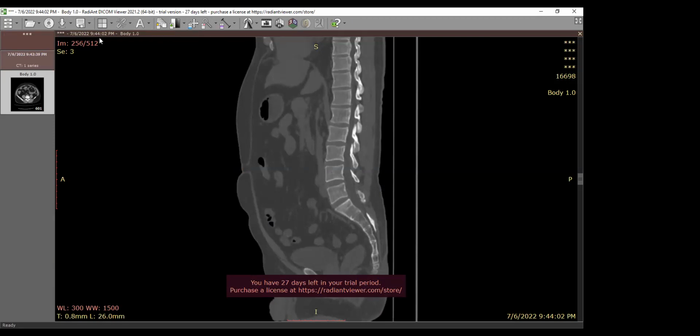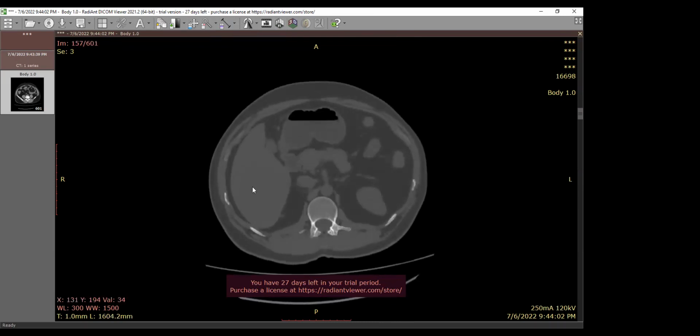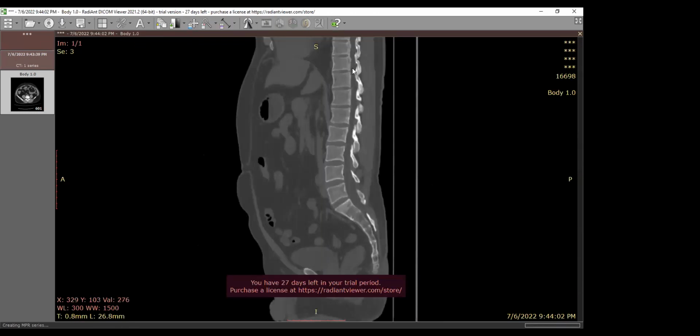You can see that in a single study there are 500 to 600 images of a single patient when I'm looking at it. And when I look at the axial images, there are 600 images that I'm looking through. So the whole body of the patient is imaged in 600 slices. What if I take only 16 of these slices? For example, this is a patient lying on the bed, and I randomly select 16 different slices. I take this slice, I take this slice, and so on and so forth, and put these on the film.